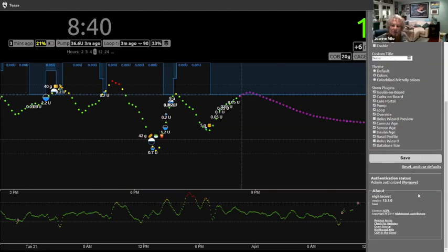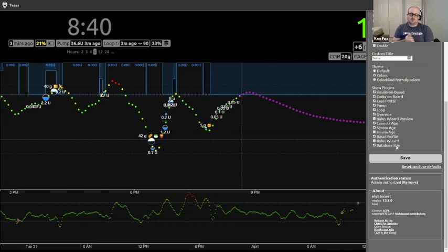Is this where you turn on a database pill? Yeah, right here, database size is the pill right here. Yep. Is that in the latest version only? As far as I know, maybe it's only in dev. I guess I could be wrong. Maybe it's in the dev version. I'm on the development version of Nightscout, which is 13.1. I believe the current master is 13.0.1 or something. Like Kenny, you're on that, right?